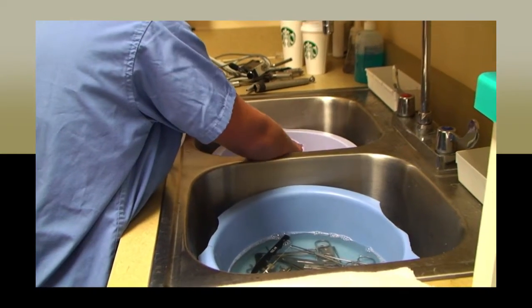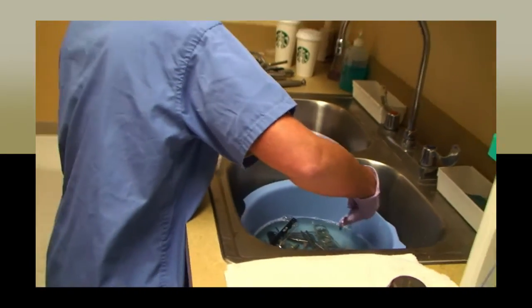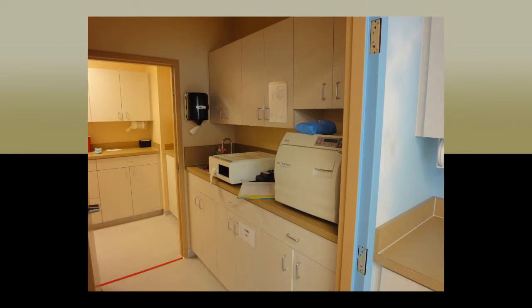There must also be room available and instruments prepared to be replacements in case any individual instrument is accidentally contaminated during surgery. To accomplish this, the circulation assistant must make use of the sterilization equipment in a manner that will ensure each procedure has the instruments needed.